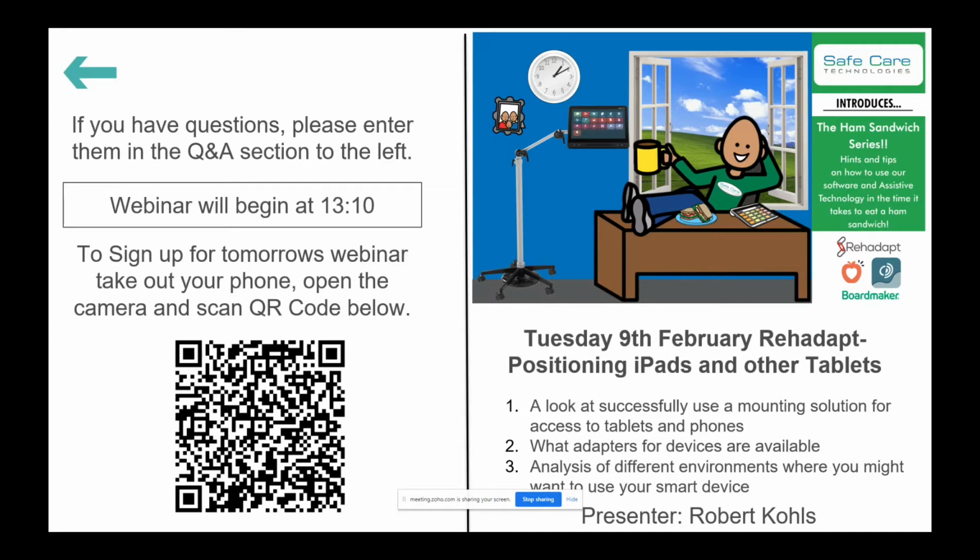Today Robert is covering positioning, iPads and other tablets. So we're going to look at how you would successfully use a mounting solution for tablets or smartphones or any smart device. We'll look at what devices, what adapters are available for different devices. So you can get specific device adapters or you can use universal adapters. So Robert's going to take you through a little bit of that.